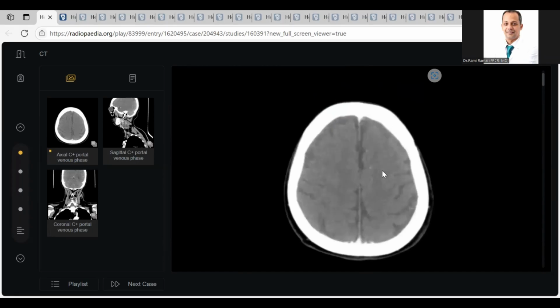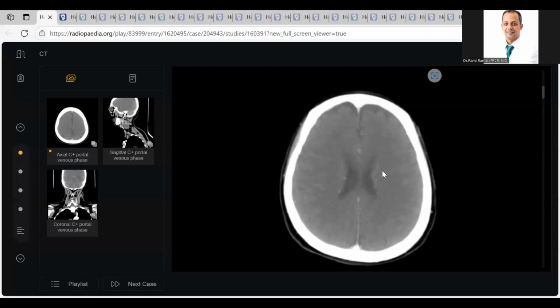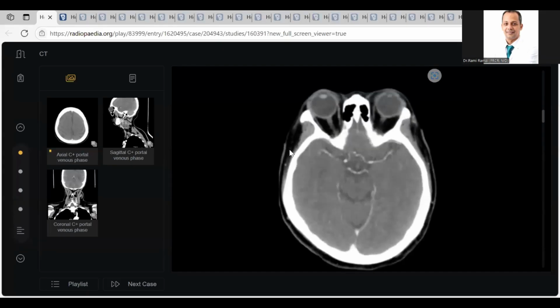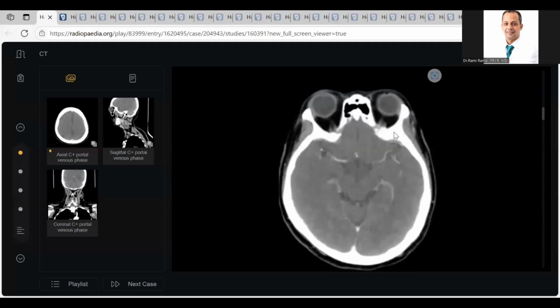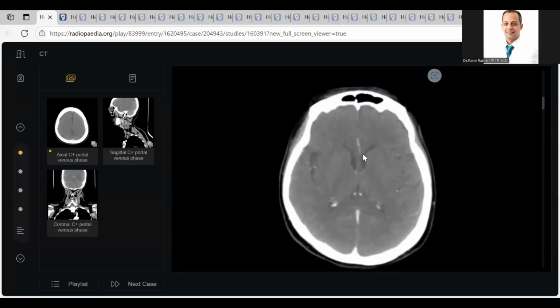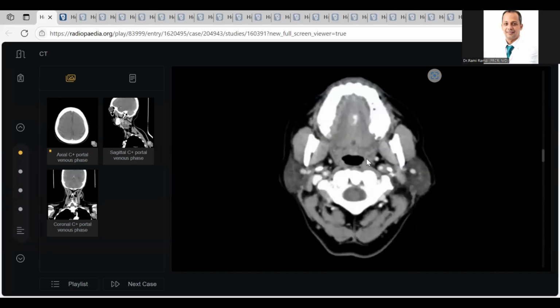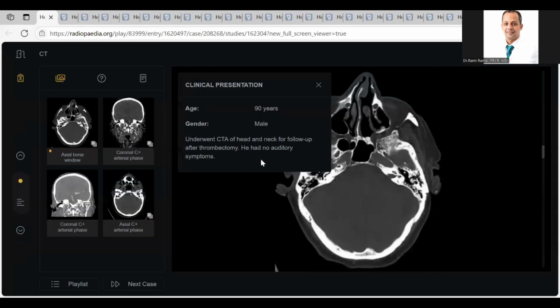I ask you what syndrome you wanted to exclude. If I told you what syndrome, I would give you the answer. This is schwannoma, so we must exclude neurofibromatosis. We should look at the orbit, optic nerve, either schwannoma or glioma, also at the hypothalamus, and intraventricular or other sites of meningioma, ependymoma. If you tell the examiner like this, he will give you the highest mark. Thank you, doctor, so much. Next candidate.